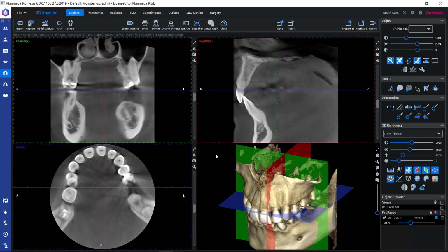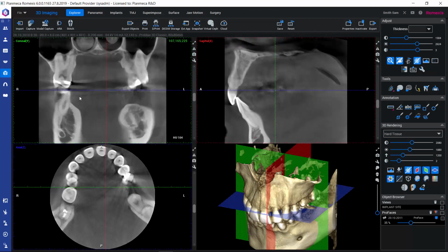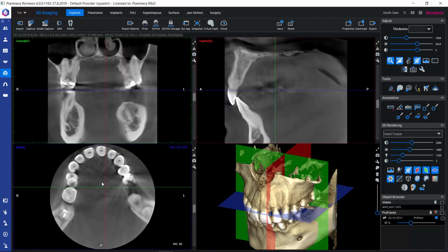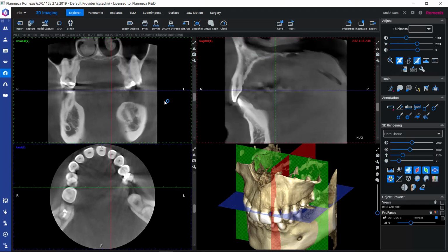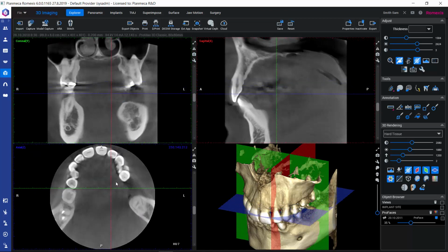While navigating in the volume, it might be more straightforward to use our mouse wheel for scrolling through the data, so that's also possible. We have here this zooming tool, so when this is active, we can use our mouse wheel on top of any of these slice views in order to zoom in and out these images. But instead, if we deactivate the zooming tool here, we can use our mouse wheel on top of any of the slice views in order to browse through the data.